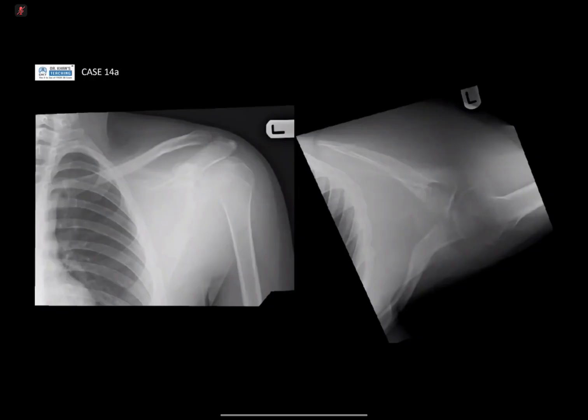What do you do? CT or an MRI? You said cross-sectional. MR. Okay, so multiple planes and multiple images in the shoulder joint I see. So there is a soft tissue lesion.